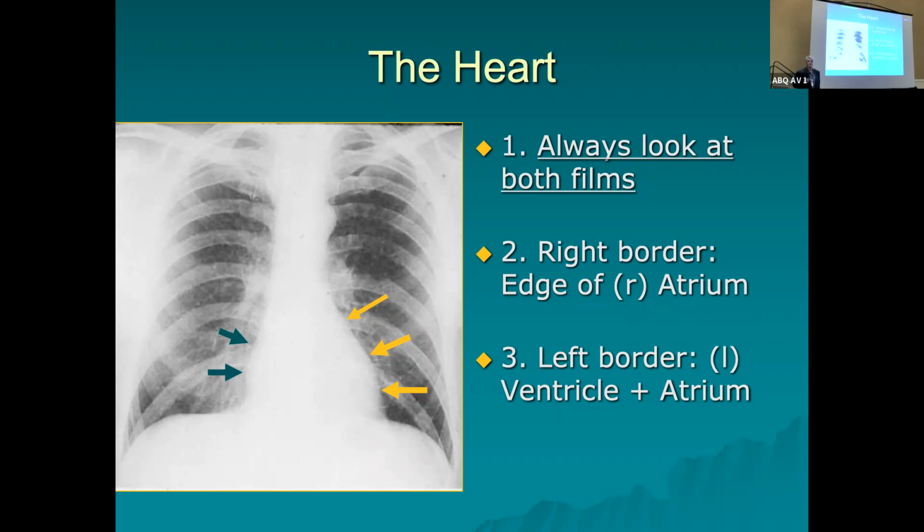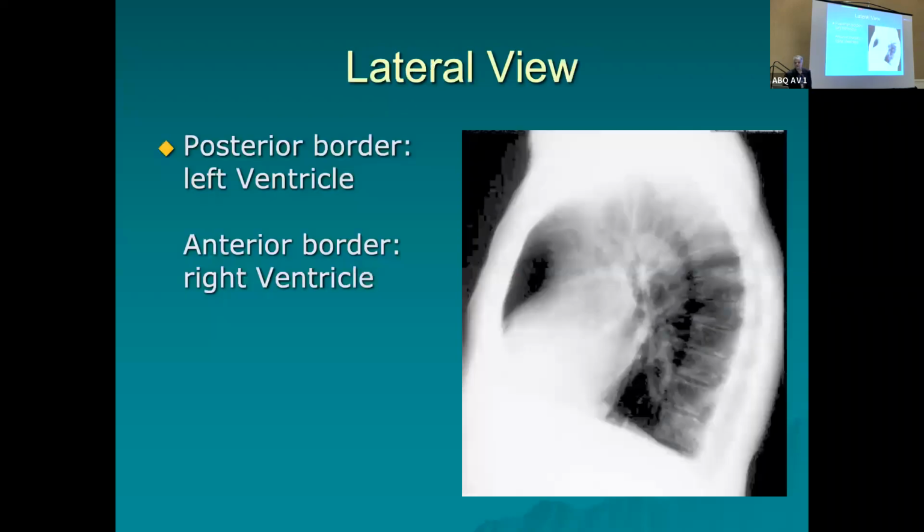If the edge of your heart or the heart border is obscured, think fluid, think buildup. It could be an infection, or it could be some type of fluid building up back into the heart, especially if you're looking down here at the sulci, but we'll get to that in a second. So always look for the heart to make sure that the borders are very clear.